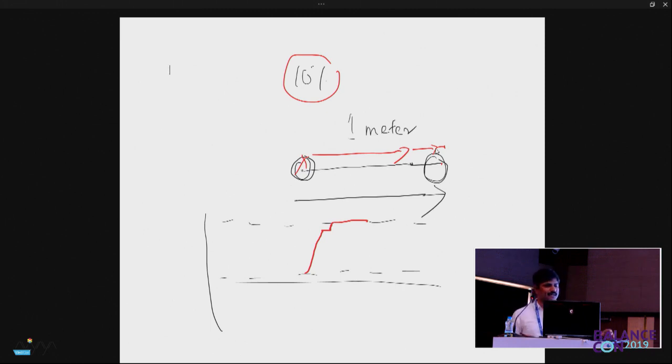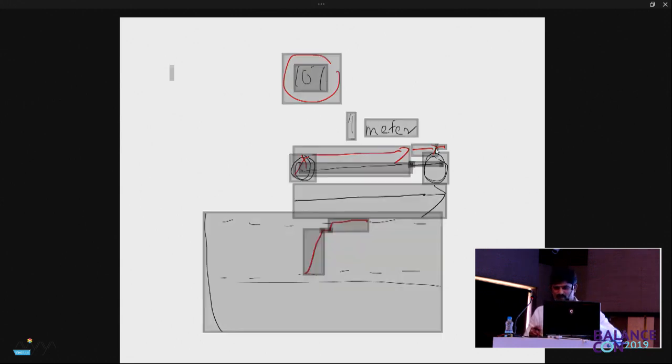So when you look at the hypometria picture that is presented there, you will see that the eye tracing looks something like this. It goes there. There is a stop. It realizes that it has not reached, and again makes one more correction. Again it underestimates the distance, but by a lesser extent because the distance is less. Then it takes one more step to reach the target. So there are multiple steps, not one step, but 2 steps, sometimes 3 steps at the end of the saccade. This is how hypometria looks. Can you make out that particular thing in the workbook? Hypometria, multiple steps before it ends?